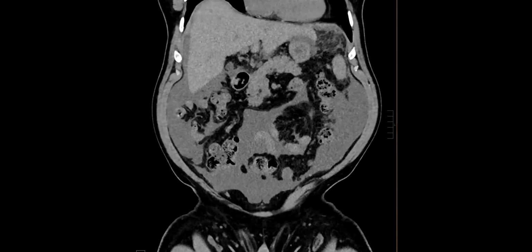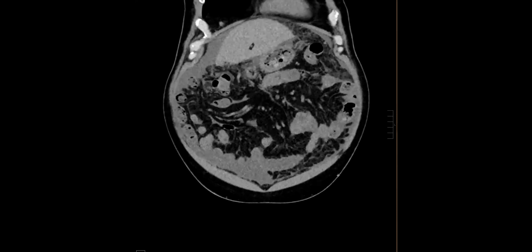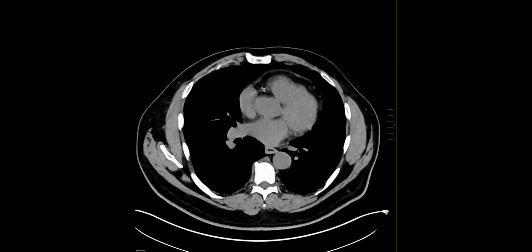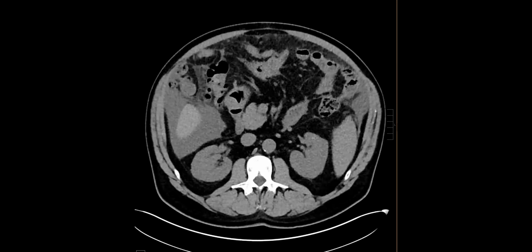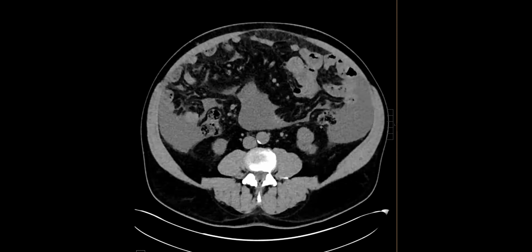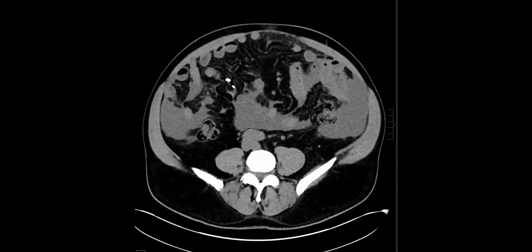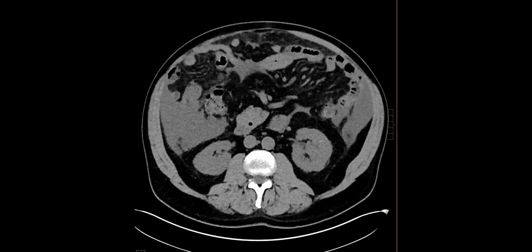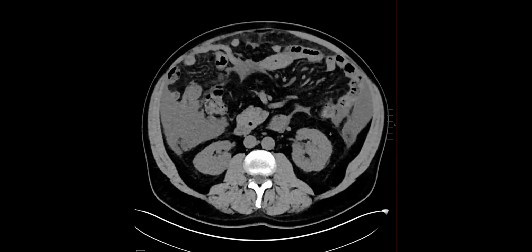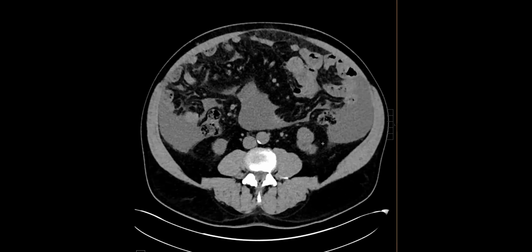And patient also had this. Oh, wow. Is that like peritonitis too? Yes, it is. No way. Yeah, way. So this is just something to keep in mind. And you biopsied it, yeah? Yeah, this is proven. Wow. And we see cocci on a regular basis here, just because of the region that we live in.